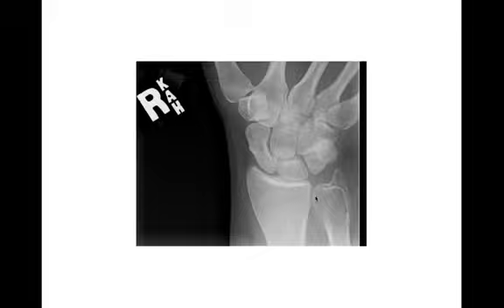But geographic lytic lesion, non-sclerotic border, epiphyseal metaphyseal located. Hard to tell whether it's centrally or eccentrically located because it's just taking up the whole bone. So in this case, probably just say centrally located because it's really just involving the whole of the distal ulna here.